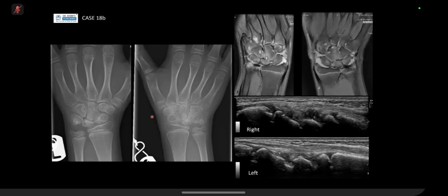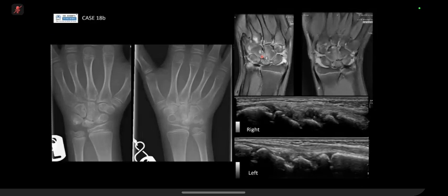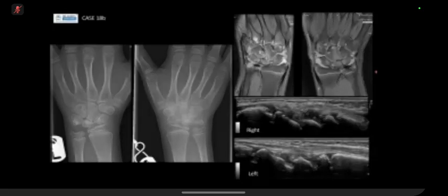On the left and on the right, you can see there is a widening of the scapholunate interval. You've got subluxation of the capitate, all looking a lot like what you think of in rheumatoid arthritis if it was in an adult. Similarly, the changes on MR show the bilateral joint effusion. All these little cystic-like appearances could be subchondral cysts. They could represent erosions more than subchondral cysts. Probably not really erosion given the extent of disease.